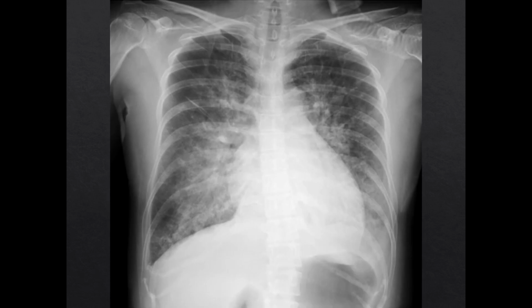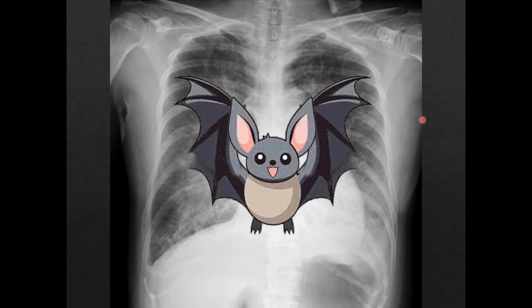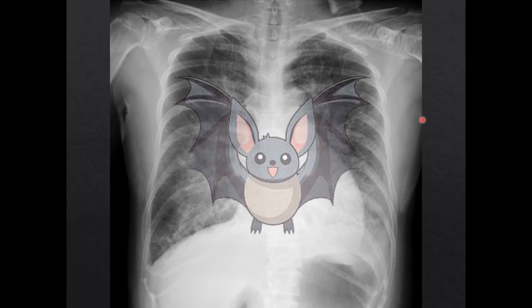This is a patient with pulmonary edema, but which type? We can look at a few things to develop a suspicion towards one or the other. One of the striking features of this image is the centralization of the edema. In non-cardiogenic pulmonary edema, the opacities are diffuse and patchy throughout the lung fields, but in cardiogenic pulmonary edema, the opacification is more central or perihilar. This is sometimes described as a bat wing sign, from the edges looking like the edges of a bat's wings.